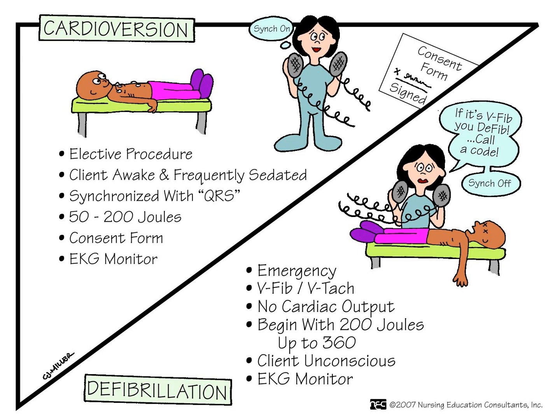Now look over here at defibrillation. This patient is unconscious. Okay, eyes are closed. There is no sync, it's not turned to the sync mode. You need to call a code. The sync mode is off. You need to call a code. This is an emergency. Okay.